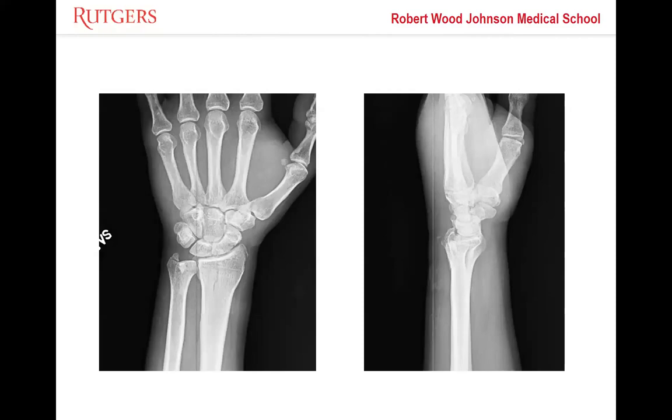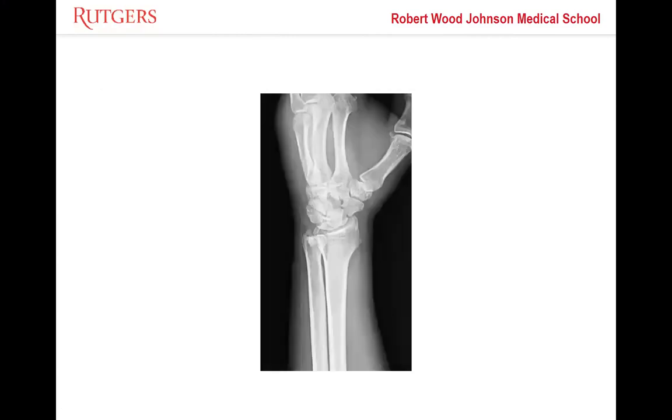Yeah. And interestingly, this guy gets, it's rare not to get the 3 views, but he came in only with 2 views. So the first thing I did was get an oblique. And so what do we see there now on the oblique? Yeah. All right, so what do we want to do on this? So Andres, what do you think?